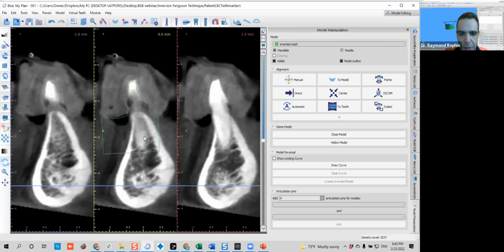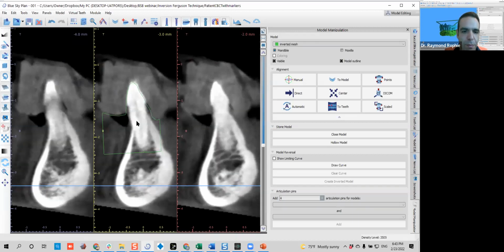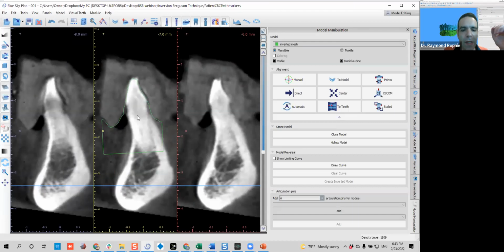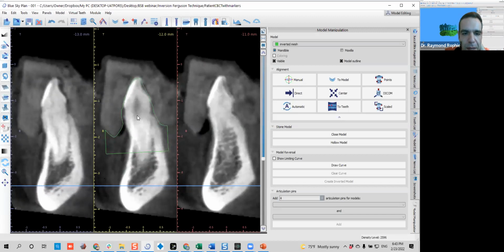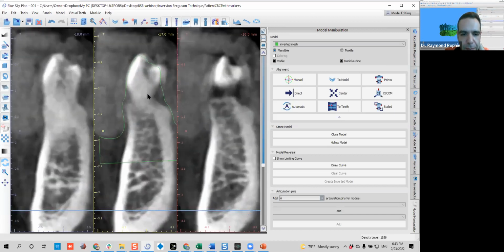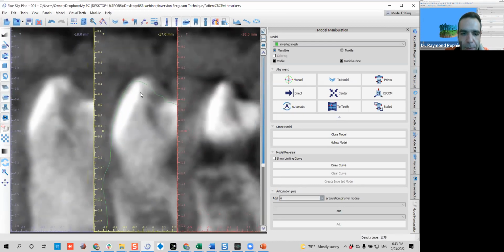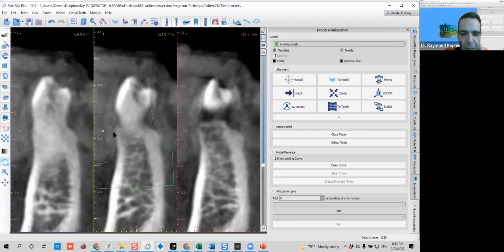These are tools, and these tools have to work for me, not me trying to do whatever the computer wants. So here, what I'm doing is I'm scrolling over, and I want to check that this line is the outline of my model. Okay, so what I want to check is that all this line is following the contour of the models.